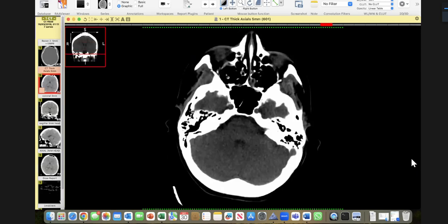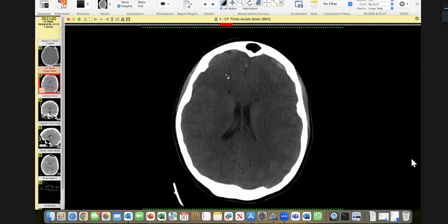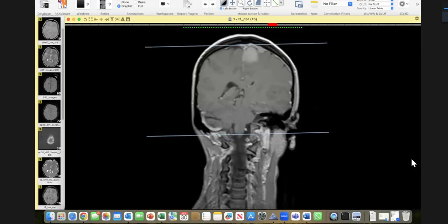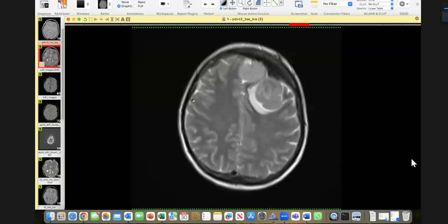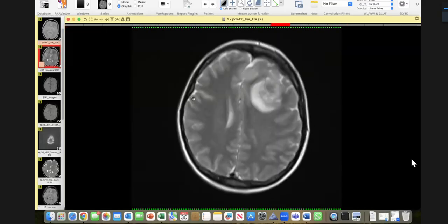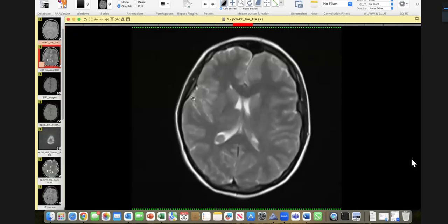Now, quickly ask for the next. This is feedback from my side. Quickly ask for the next. For example, in this case, you went on this T2-weighted sequence. You did well. I'm not saying that you said anything wrong. This one was in the ventricle.